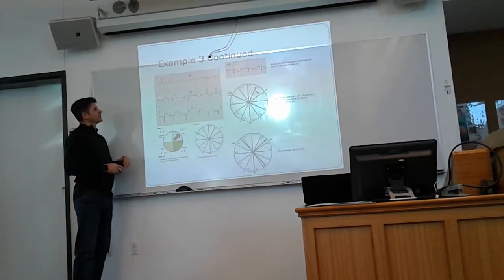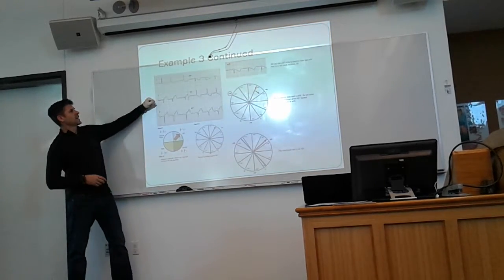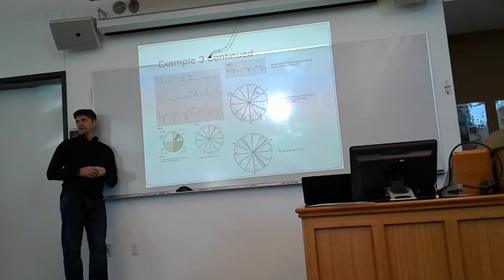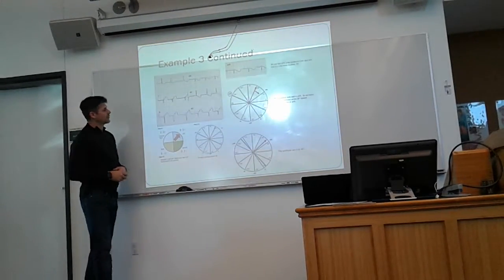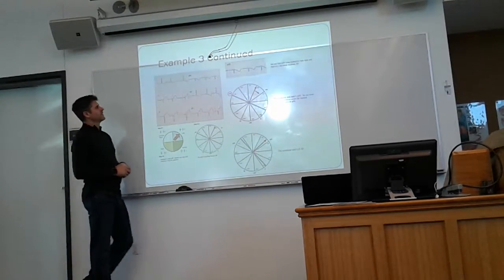So we've got a positive lead 1, we have a negative AVF, so we're looking at a left axis deviation. We have a negative lead 2, so we know that it's a pathologic left axis deviation. So we've already isolated it within 60 degrees, between negative 30 and negative 90. We look at our most biphasic lead, and we agreed previously that it's AVR, because AVR is the smallest of all the leads as well.